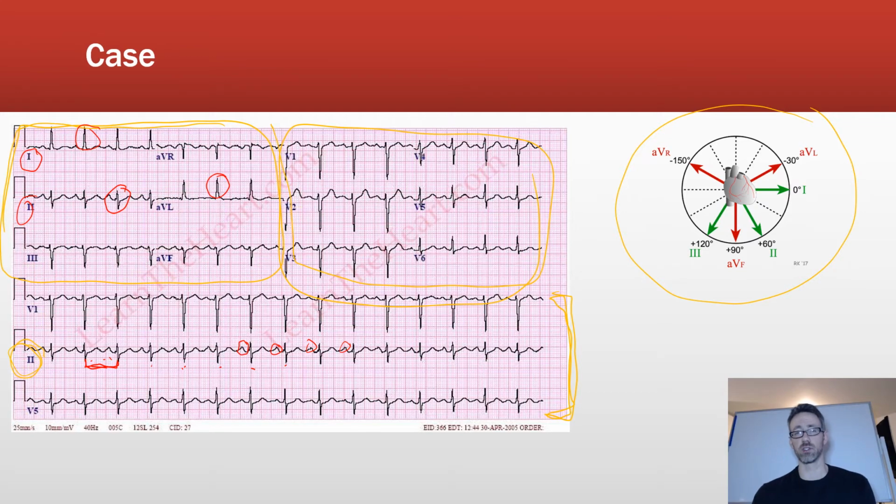So now I actually have to do an assessment to see if this falls within the normal range. To do that, I look next in the limb leads for the one that's most biphasic, which I think we found already, and that's in 2. So in 2 it's biphasic, knowing that 2 is, I'm going to show you over here, 2 is at 60 degrees, okay? And the negative deflection might be a little greater than the positive deflection. It's a little hard to say here, but let's say it's dead on 2, okay? Let's say it's biphasic at 2, or there's an isoelectric complex there.